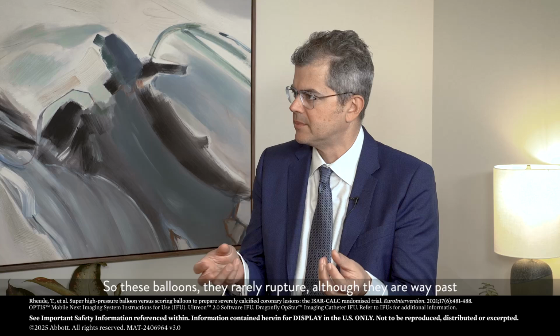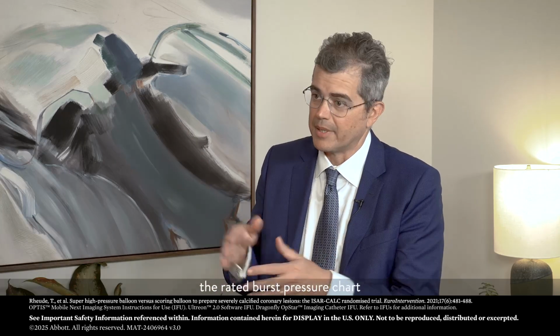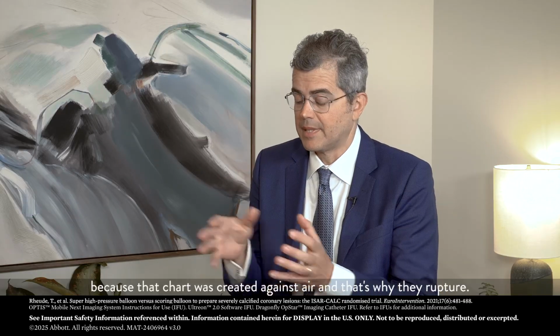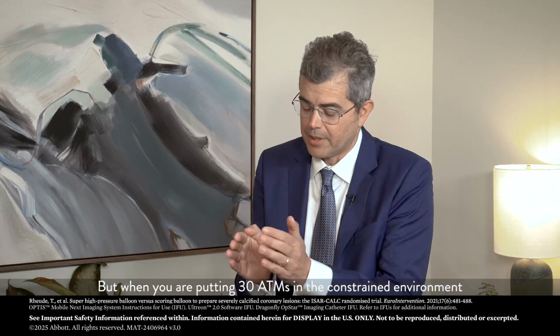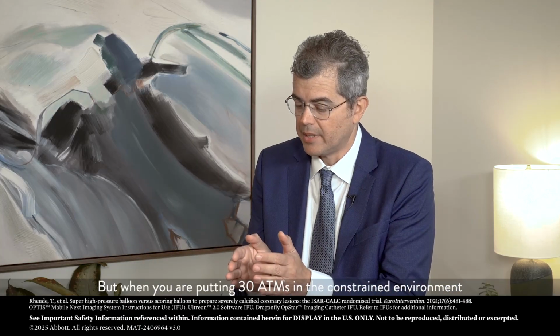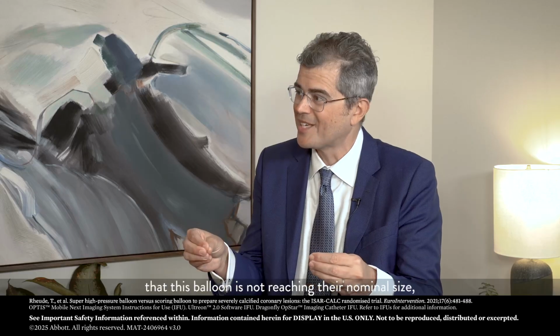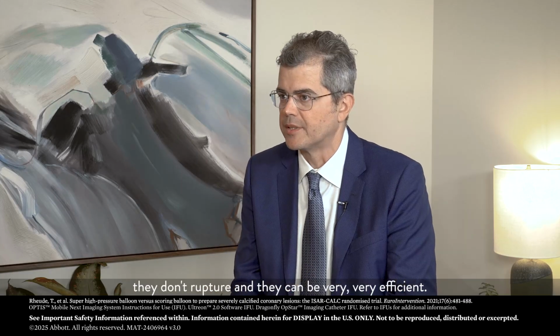So these balloons rarely rupture, although they are way past the rated burst pressure chart, because that chart was created against air, and that's why they rupture. But when you are putting 30 ATMs in a constrained environment where this balloon is not reaching its nominal size, they don't rupture, and they can be very, very efficient.